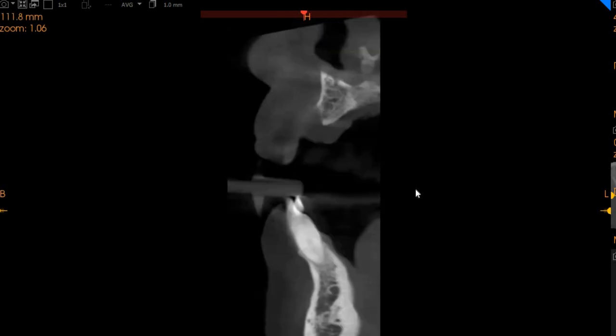The other very important aspect in this is that this is the upper left lateral incisor, the maxillary lateral incisor on the left quadrant. Here again, we don't have architecture of the mesial, the buccal or the palatal cortical bone. We've got severe ridge atrophy. The ridge width in this region is approximately 6.4, but this is going to be very apical bone in the apical 1/3 of the adjacent central incisor, and we've got approximately 8 millimeters of ridge height.